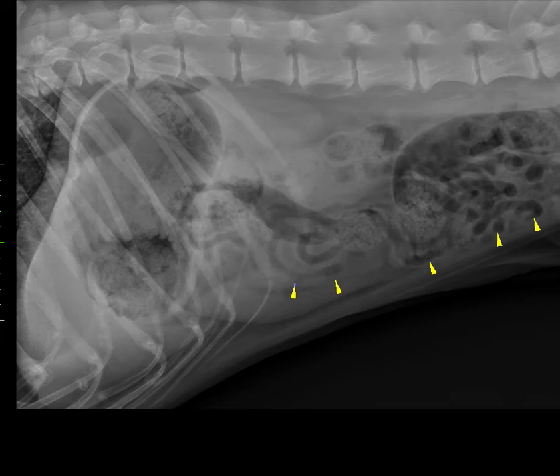So, for this case, I would say that the abdomen is unremarkable, provided that we can confirm that the patient had recently ingested a meal. I would suggest follow-up radiographs to ensure the gastric contents are just normal ingesta and pass, only if the patient has clinical signs such as vomiting. Otherwise, it's probably okay to trust the fact that this is the appearance of normal ingesta.